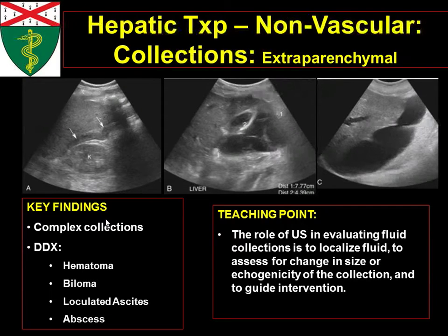Are they getting bigger? Are they getting smaller? Right? We want them to get smaller. And ultrasound is also very useful as a modality that will guide our drainage of these procedures. Right? If we can see it on ultrasound, we can probably get a needle in it and drain it out, and that's how we're going to figure out what's going on with it.